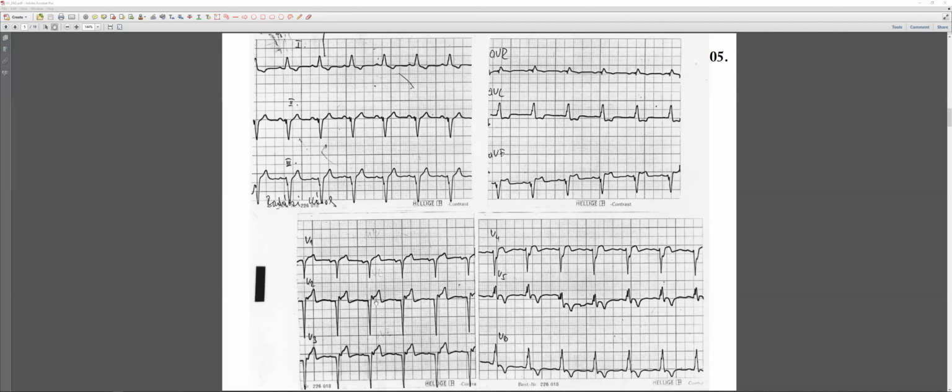This is what we mentioned, that not every pathological Q wave means necrosis. Especially when we do have a left bundle branch block, it's almost impossible to diagnose an acute anterior MI, because they show similar signs. Because everything goes from the right to the left. And what caused the extreme left axis deviation? What do you think? Yes, you said it, minus 70, you said it.